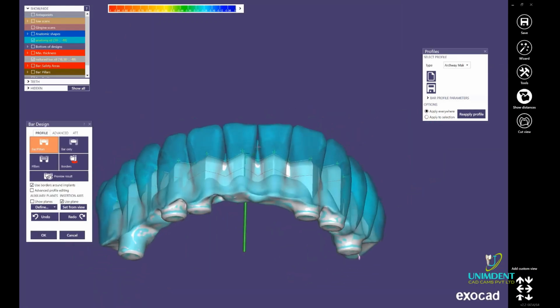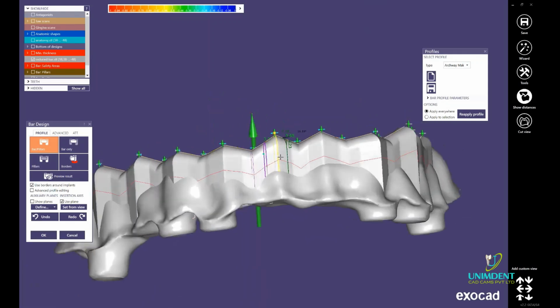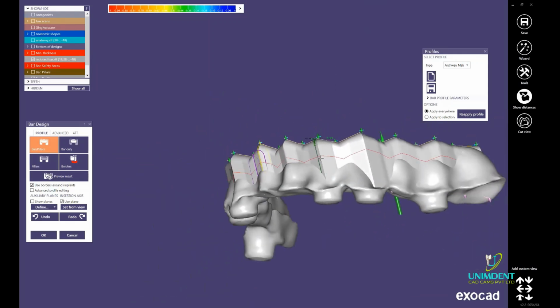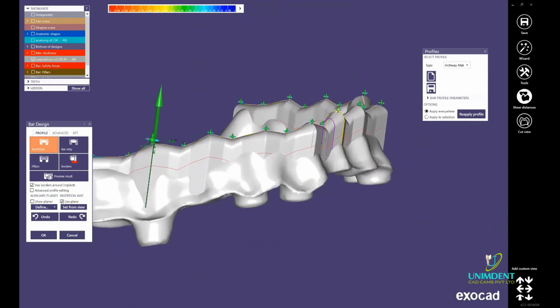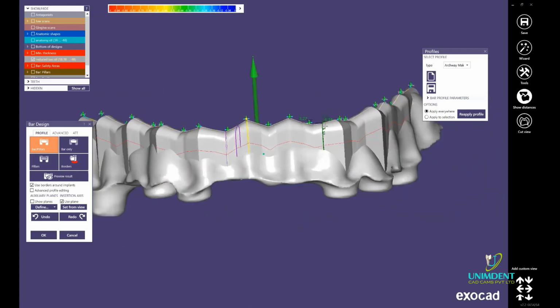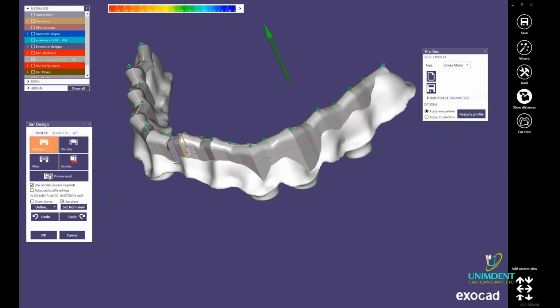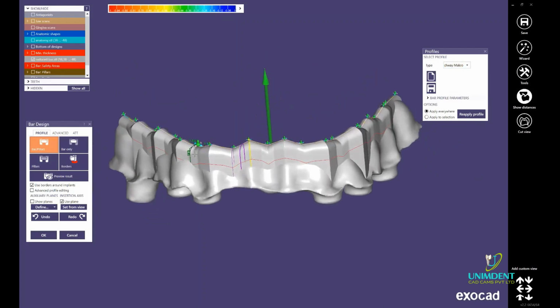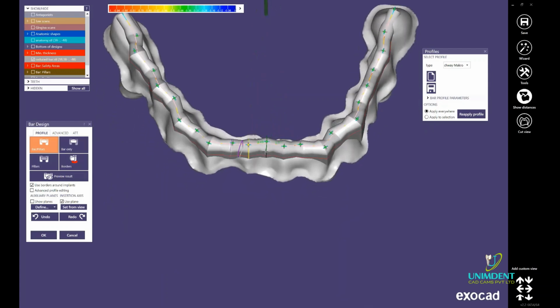So this is more or less what we want to achieve. By pulling up and down these little arrows, we can achieve a shape like this. It's up to you what you want to do. If you want to make a straight bar, or a bar like this, then of course here you have the type of shape. I choose the rounded shape. And don't forget that at the end of the bar, once the bar is a unique piece, you can always freeform, so you can always make a final touch.